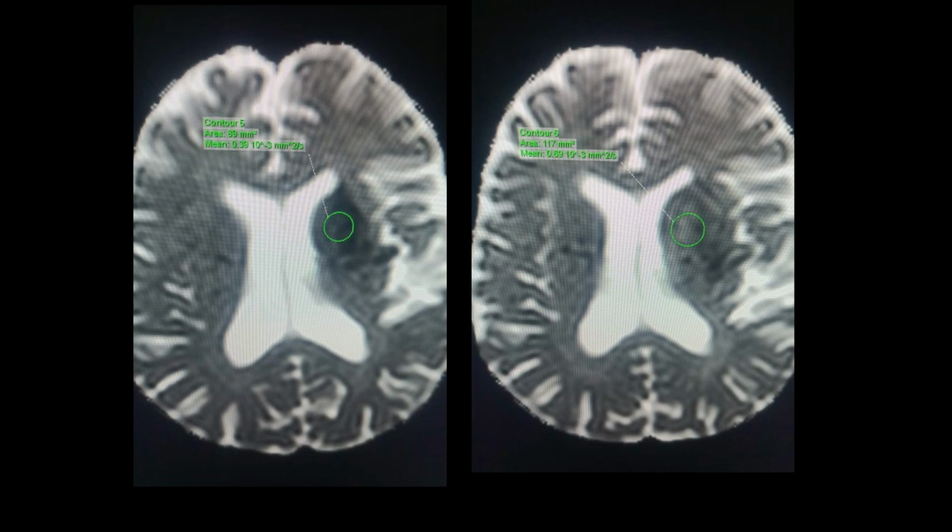Let me show in our patient. In our patient, the ADC value was 0.3. It was less than 0.5, but still, since this patient had a huge penumbra, we decided to still go ahead and open this particular blood vessel. And how was it post procedure? Similar areas. Can you see similar areas? The ADC reversal has occurred. It is not as black as it was earlier when the patient was occluded. Now if you see the ADC map, it is 0.6. So it has increased to more than 0.5. According to this article, if you had taken the interpretation, it means this area will not be salvageable. But this is one of those lucky patients who did extremely well, and even the core has got reversed.